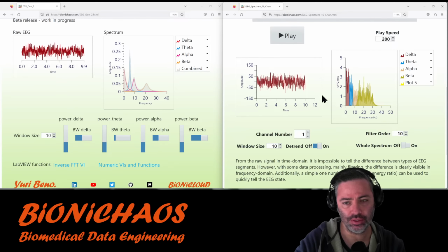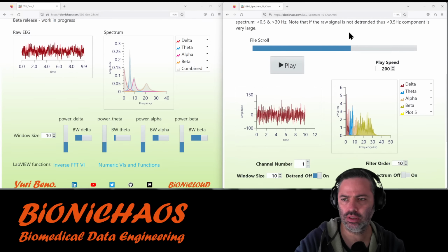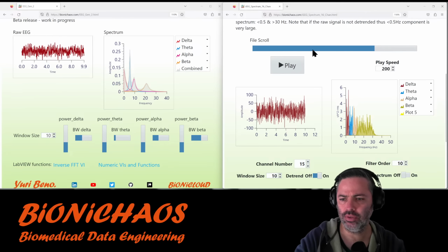And on the right, we have real EEG. And simply by doing this, I mean, if we just go into random, this is flicking through channels. This data is an intracranial 16 channel recording.